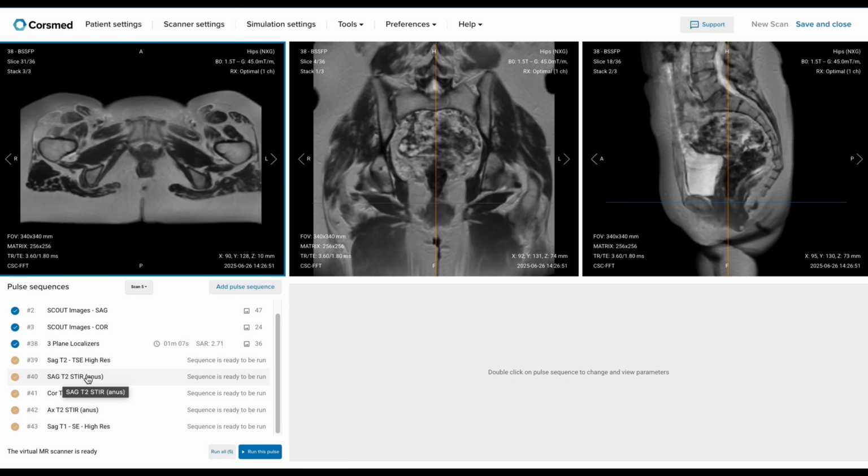Suppressing the fat is also needed for associated findings like inflammatory edema and cellulitis, which can occur with prolonged inflammation. Fat saturation enhances the contrast of inflamed tissue, increasing the CNR, or contrast to noise ratio, we talked about at the beginning. And we run this sequence for all planes to understand the relationship and spread of the fistula. Then we run a T1 in a relevant plane where we see the fistula, or something suspicious like a scar, tumor, or chronic change to show structural or postoperative details.